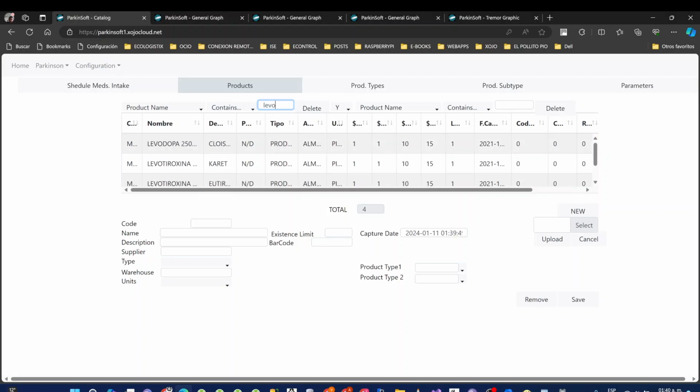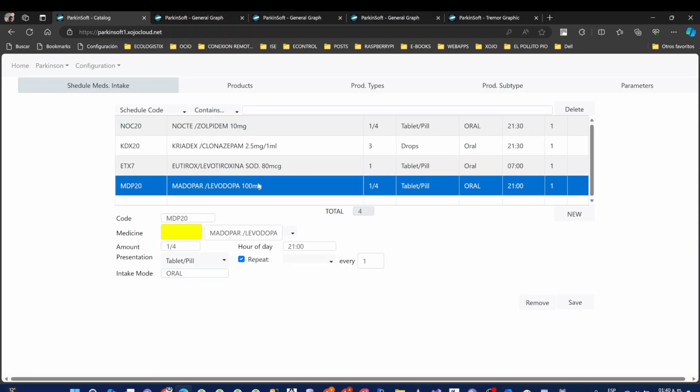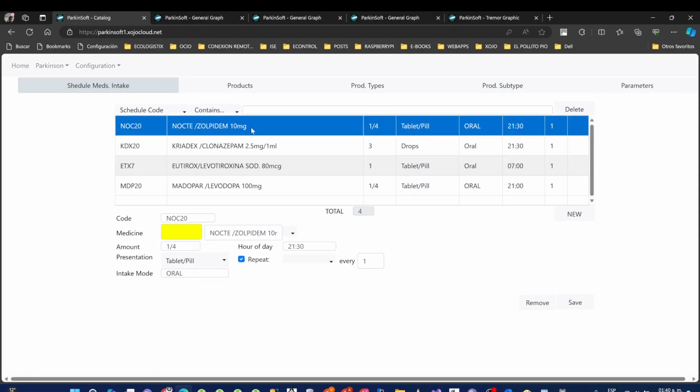The app manager or the patient must make adjustments to the medication intake catalog, within the operational catalog, as soon as a prescription change is received from the doctor. For a manual capture, you must enter the Event Capture module, fill out all the fields, and click on the Save button.